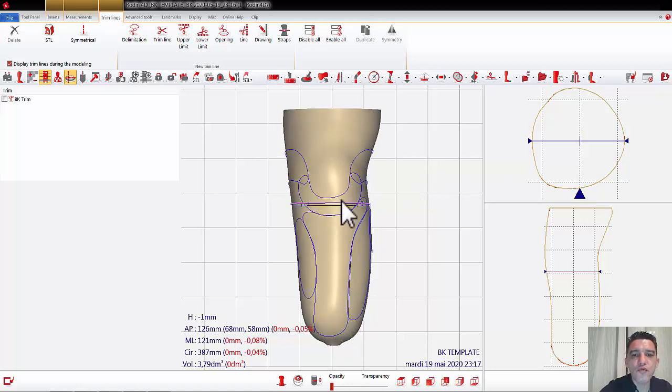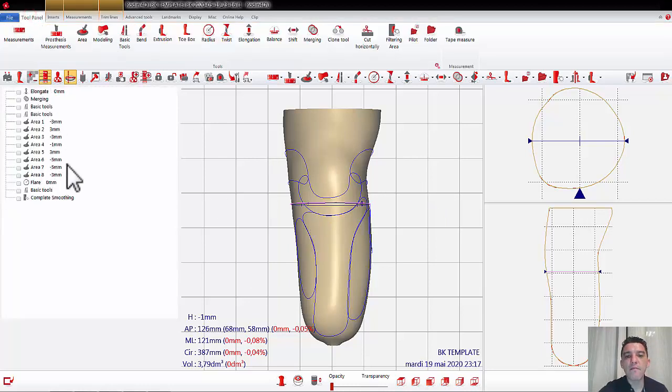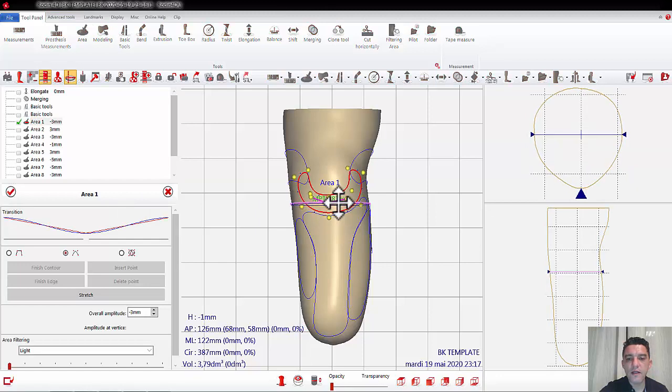In case you want to import it in another shape with differences according to the height, it's possible that some areas are higher or lower, so you need to edit and move up and down. For example, imagine that you don't want to have this one here, so you can move it where you want, but you save time.